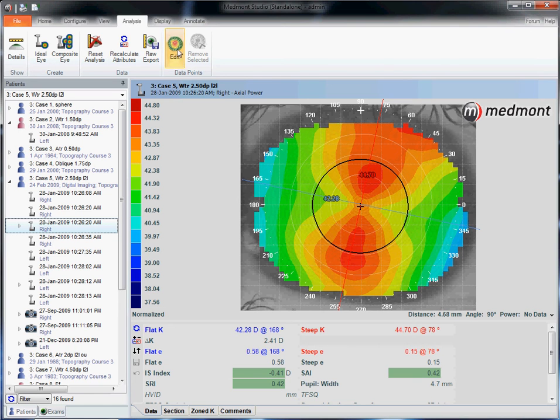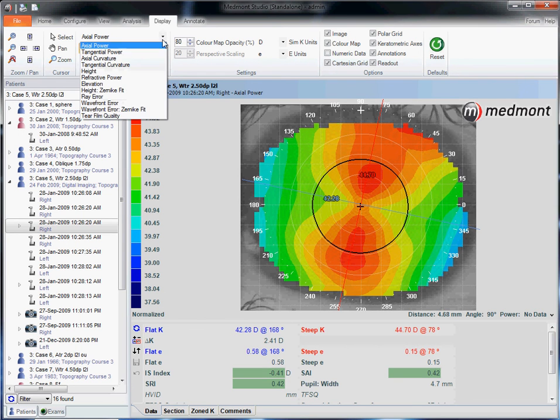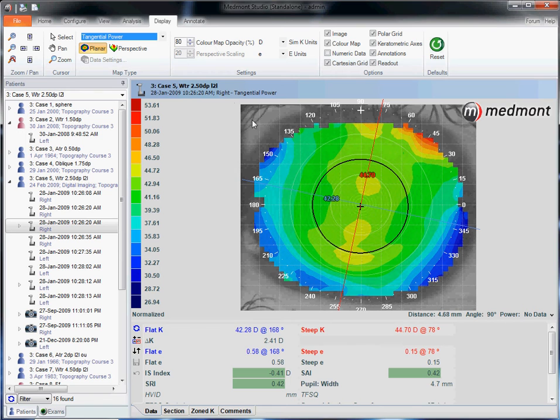Let's look at this patient another way. Again, we've looked at the axial interpretation, and we see that we have a limbus to limbus corneal astigmat. We switch over to the tangential. We look at the contours of the eye, the green-blue border. It appears that many of the hottest contours are stretched a little bit toward the higher side. So we might expect RGP lenses or orthokeratology lenses to want to position slightly superior.